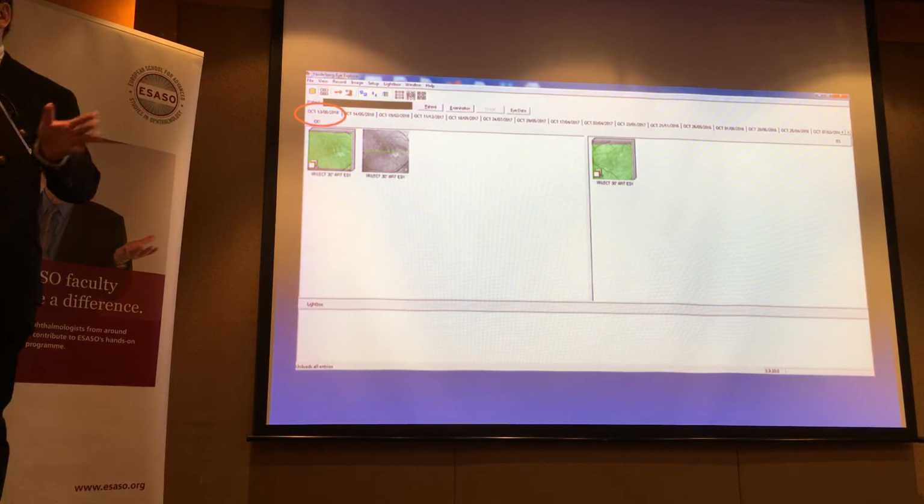Right? Printouts. So again, I discussed printouts. We went through, and again, this is something that is very useful for some overviews. All right. But what I would say is, do not rely only on the printouts. Okay. As an example, I know it shows both scans, but look at this.